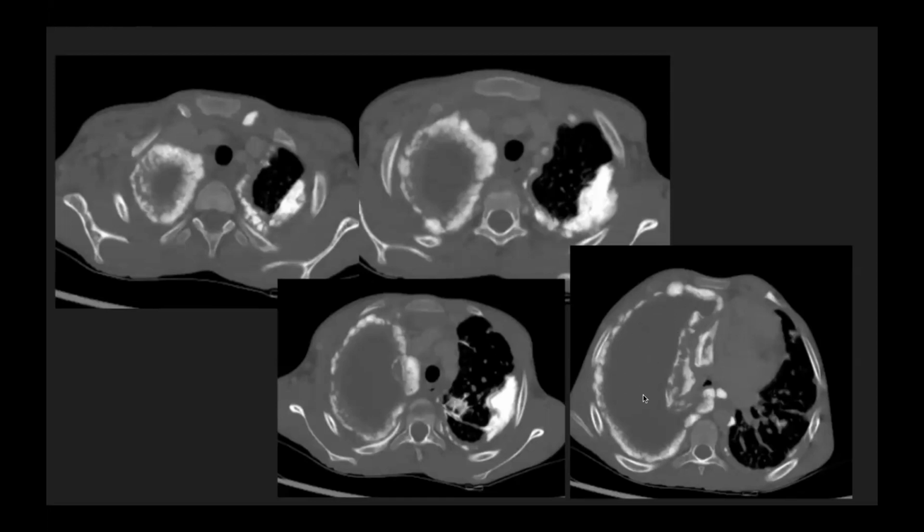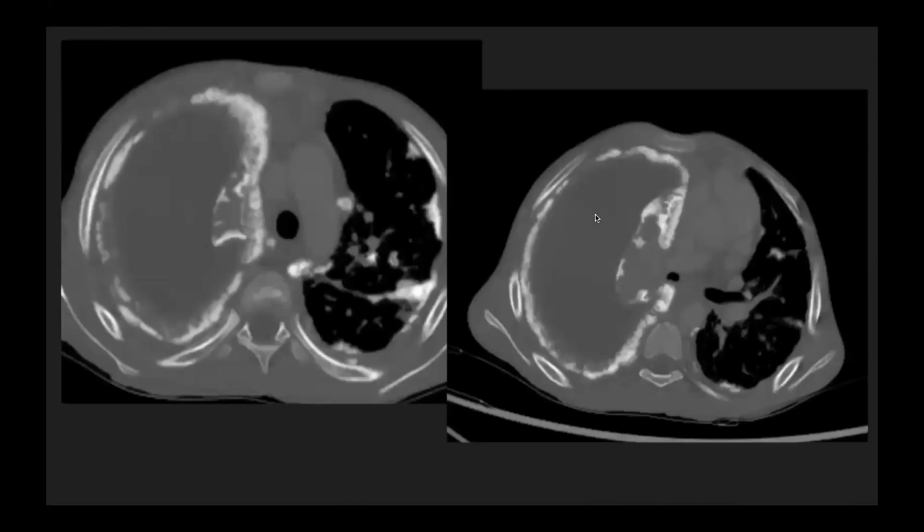This is the pleural space, the pleural cavity, and these are the ossifications at the two layers of it. And this lung has been trapped within. Similar pleural-based metastases are also seen. So we can see this encasement of the lung by the pleura, and the lung is not able to expand.